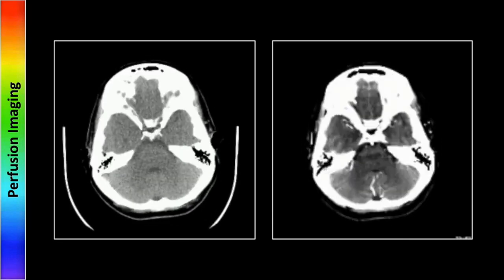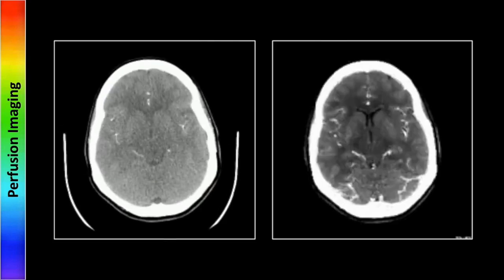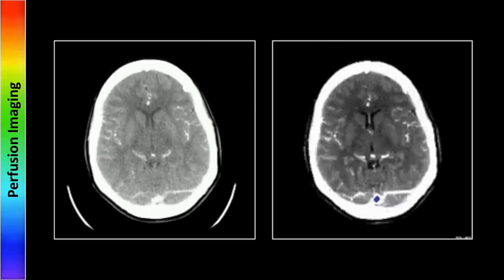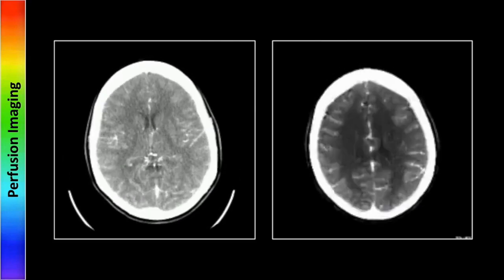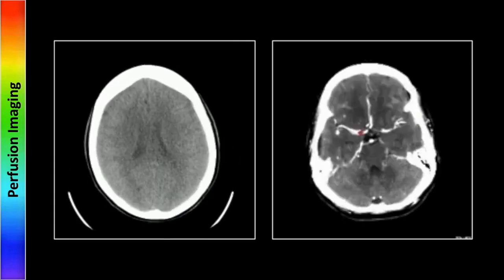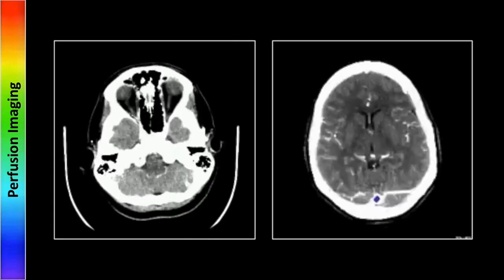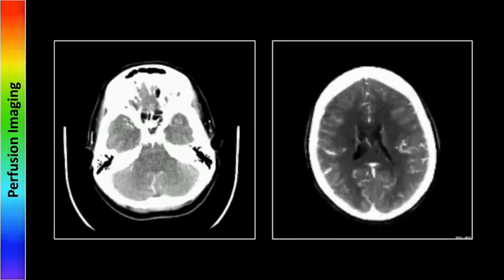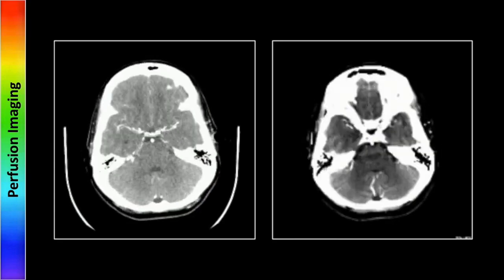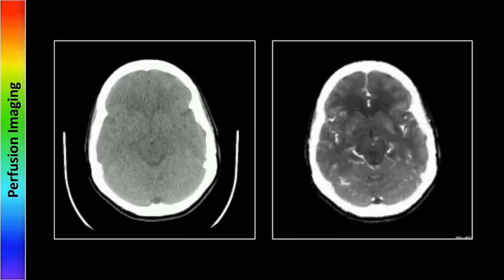On the right, you'll see the designation screen where a red dot is placed on arterial inflow and a blue dot for venous outflow. Those are frequently abbreviated AIF for arterial inflow and VOF for venous outflow. It is the radiologist's job to identify those markers and determine that they are in fact placed on arterial and venous structures.